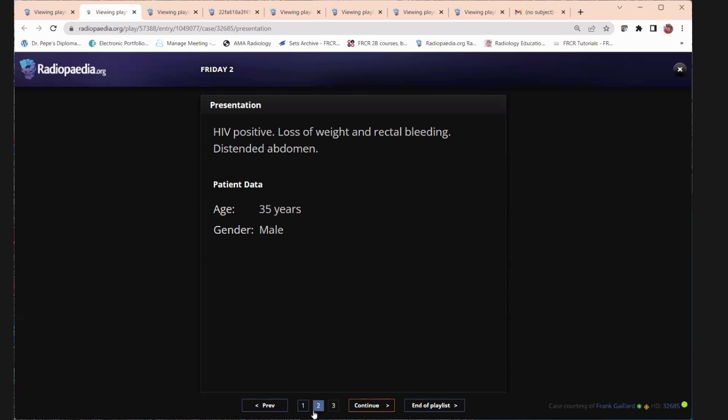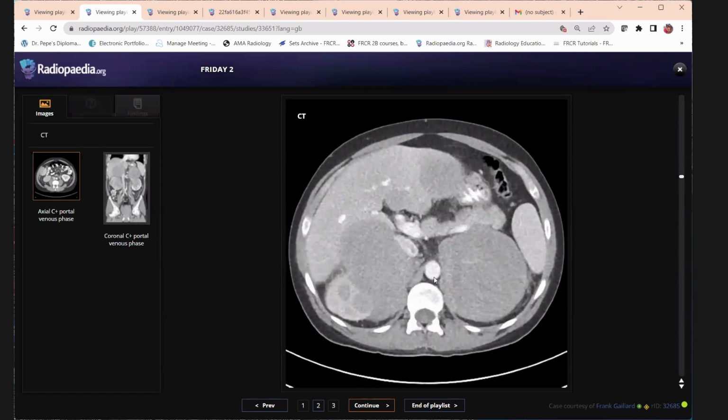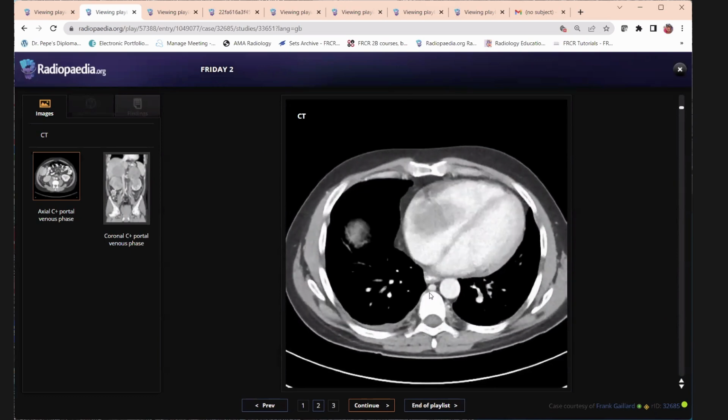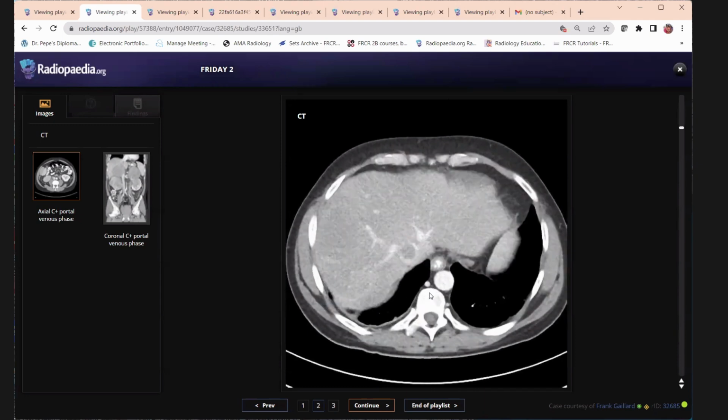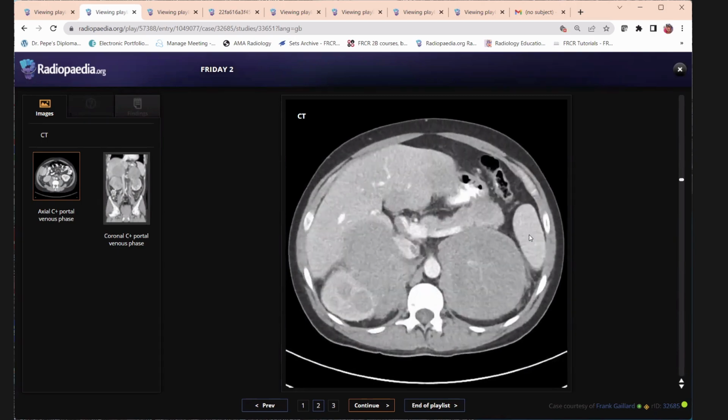Yes. So this one, you picked up all the findings. You said all the things. The only thing I wanted to add is that you should give differentials. You are not giving differentials. You are just giving one diagnosis. Here you told about lymphoproliferative disorder. That is very right. And it was a Burkitt's lymphoma.